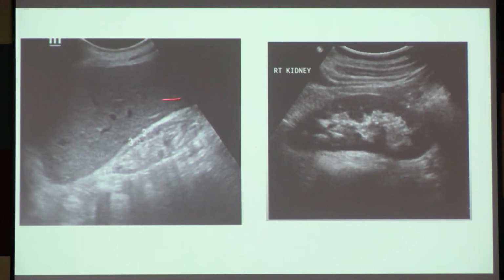Okay. Now, can you actually see any difference between this kidney and this kidney? So it has become echogenic. Dense is a word that is used for CT scan. Yes, so it has become echogenic. And how do we say that? It is always in terms of the liver. Any echogenicity is decided in terms of the liver. We take the liver as isoechoic. Anything above it is hyper, anything below it is hypo. We can see this is below it, so it is normal.